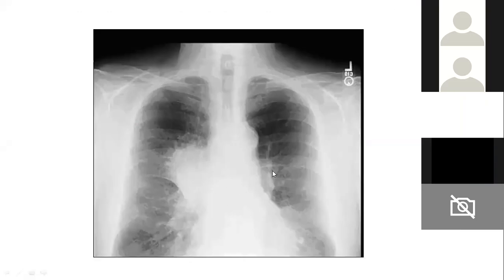So now based on that, this is one of the X-rays that we already discussed, the second or the third slide. So now can we tell where it is arising from?